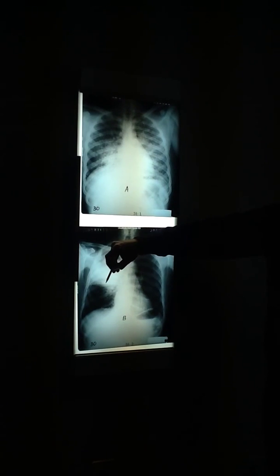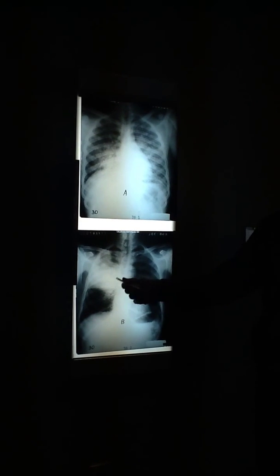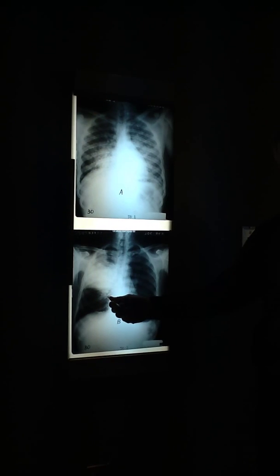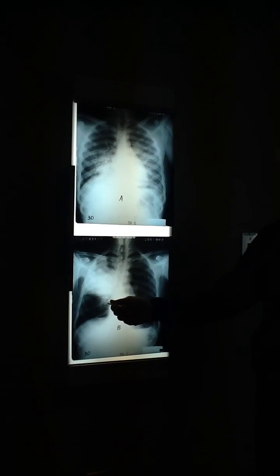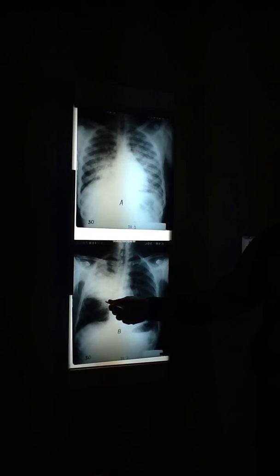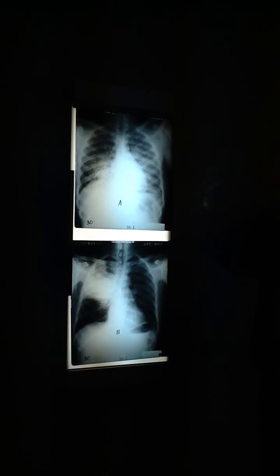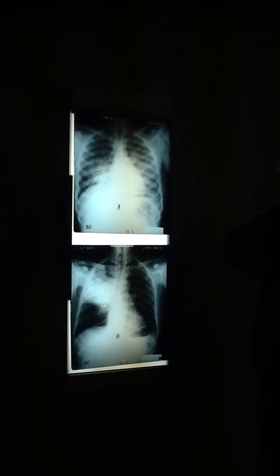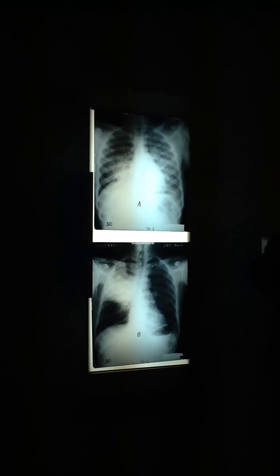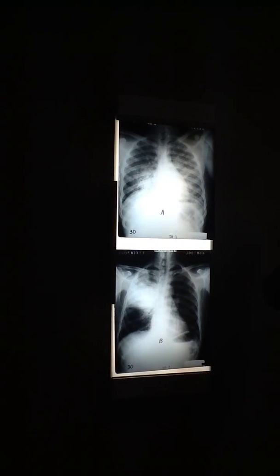Now, if you can see the fissure over top of this density, are they touching each other? No. So, is this density in the middle lobe or in the lower lobe? Lower lobe. If it was in the middle lobe, it would be on the other side of the fissure. So then you'd have water density on this side of the fissure, water density on this side of the fissure. How could we see the fissure? We can't. You can see the fissure here if the density's back here, though, because then you've got air below the fissure. This is not a silhouette.